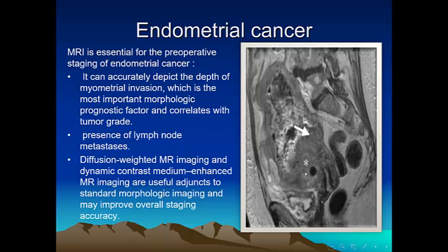Of course, this is a neoplastic process involving most of the uterine cavity, infiltrating the myometrium, causing pyometra or hematometra. To say pyometra or hematometra, we must put a T1 picture. Invading the cervical stroma here also. And this is the normal cervix, not here. This is the cervical stroma infiltrated. So here it is reaching the cervix.